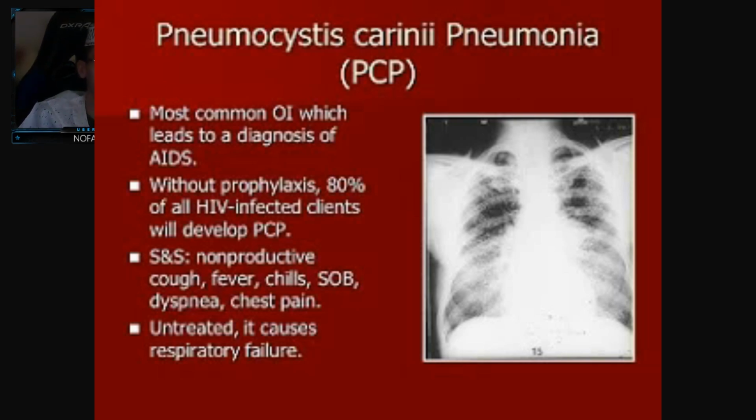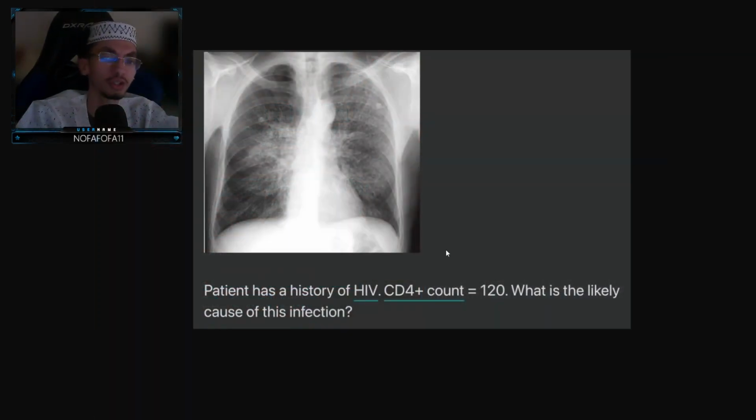You take a chest x-ray and you present with this finding. I told you all this about Pneumocystis jirovecii because this is what should be likely in your mind. It should be an opportunistic infection in an HIV patient. That's why it is important to link a patient's presentation to the imaging so that you know what to look for. Now, in this patient's imaging, we have a problem specifically seen in the lung interstitium. When I look at the hemidiaphragm and the costophrenic angles, the sharp ones, they're normal.